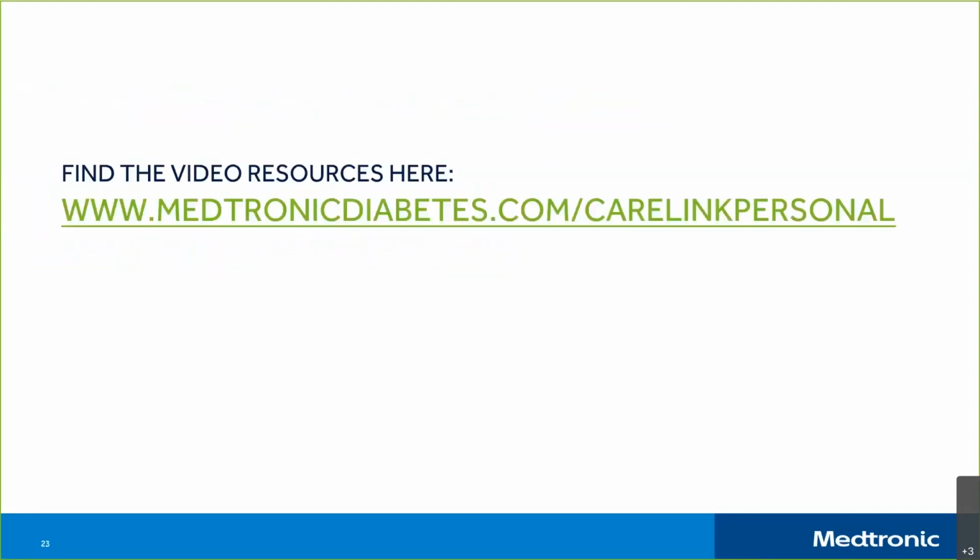If you're using your meter to test your blood sugar, it will download the pump, even if you're not testing. So if you're not using that meter to test your blood sugars, it will still be able to download your pump. Kind of think of that meter as acting like a bridge. It's grabbing the information from your pump and wirelessly transmitting or depositing that information into your computer where it's accessible to you and your provider to see those reports.